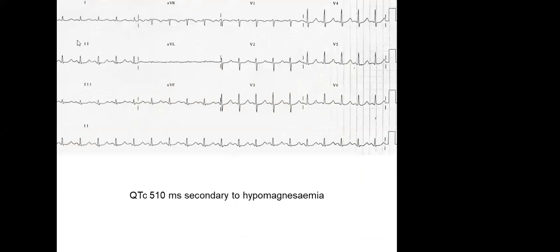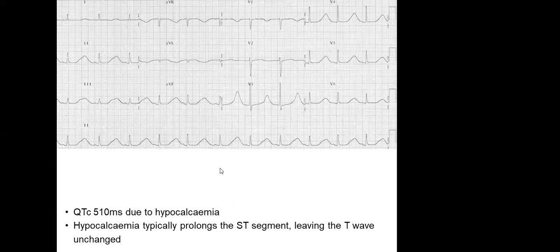Here again, in lead 2, we need to see how U wave has formed in hypomagnesemia. Torsades is a possibility if we do not correct the hypocalcemia secondary to hypomagnesemia, and at this stage hypomagnesemia is associated with long QT. Anyone will identify that ST depression with involvement of U wave is there. We take this as a tangent, we calculate the QT interval and we identify the cause of the corrected QT interval prolongation.